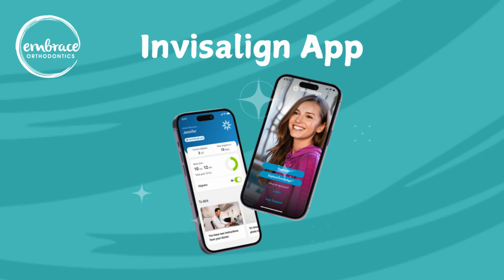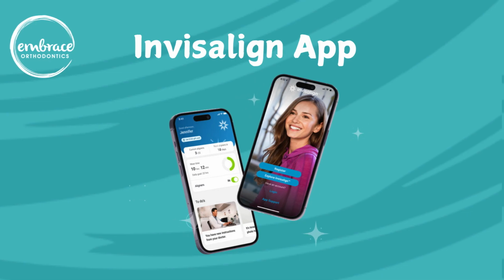Welcome to the Invisalign app. This app will help you keep track of your Invisalign aligners as well as allow Dr. Lee to keep an eye on your progress between appointments.